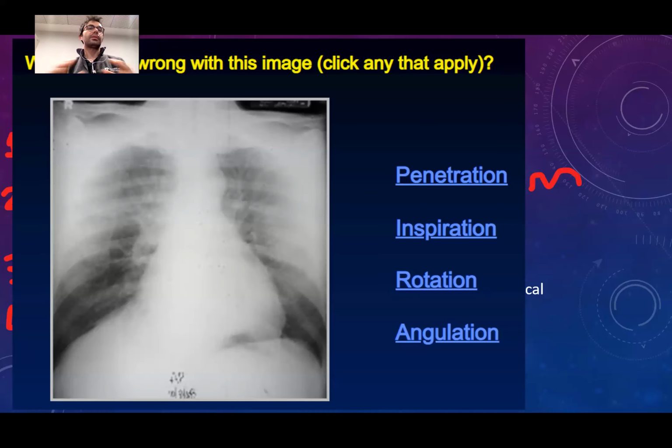In the oral exam, I want you to go through these technical parts of the chest X-ray very quickly. This is one of your duties. You should start with the technical part and then go to the systematic approach for pathologies.